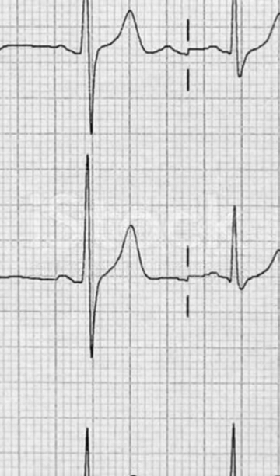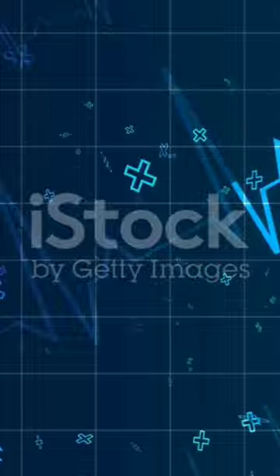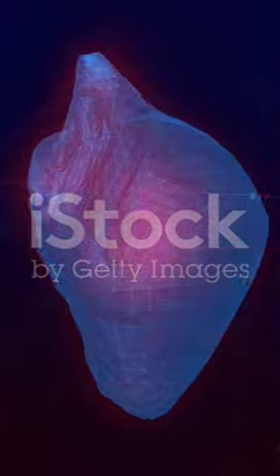Then we have premature atrial contractions or PACs. Here you'll see an early P wave with a different morphology followed by a normal QRS complex. This happens due to an early electrical impulse from the atria.